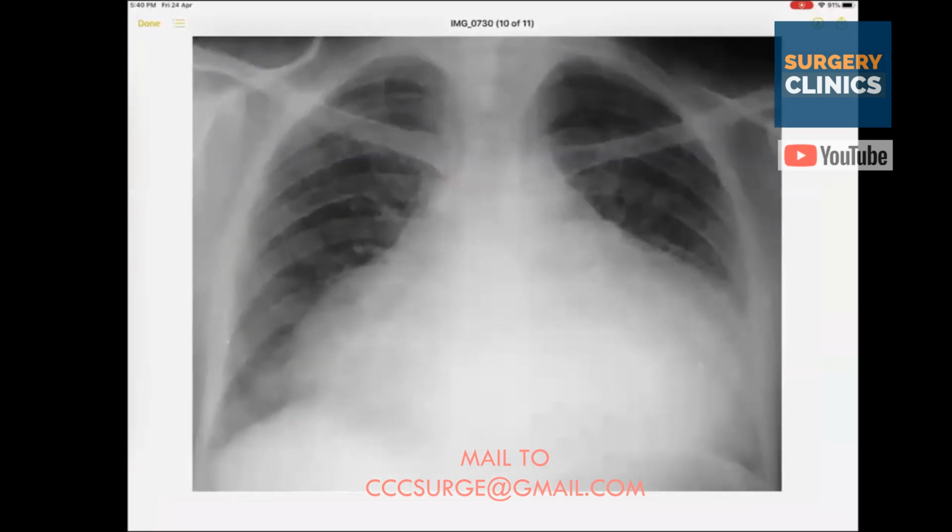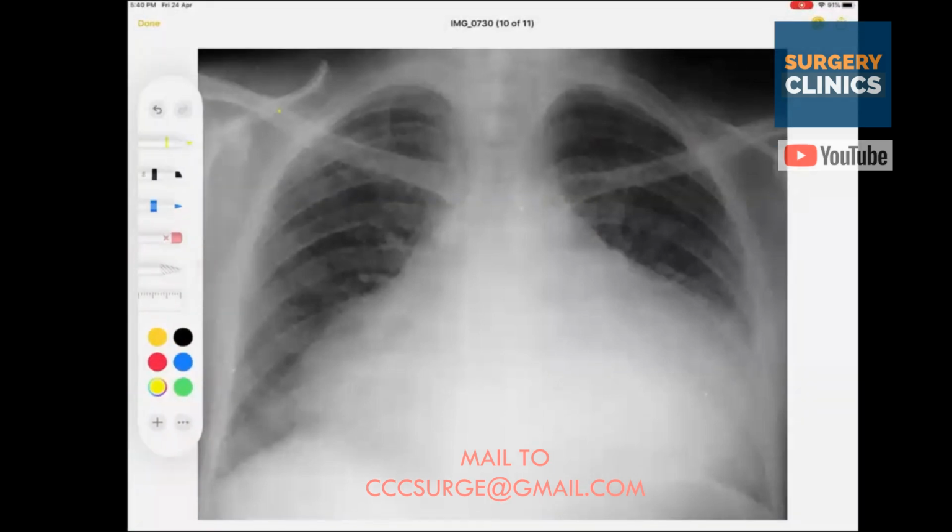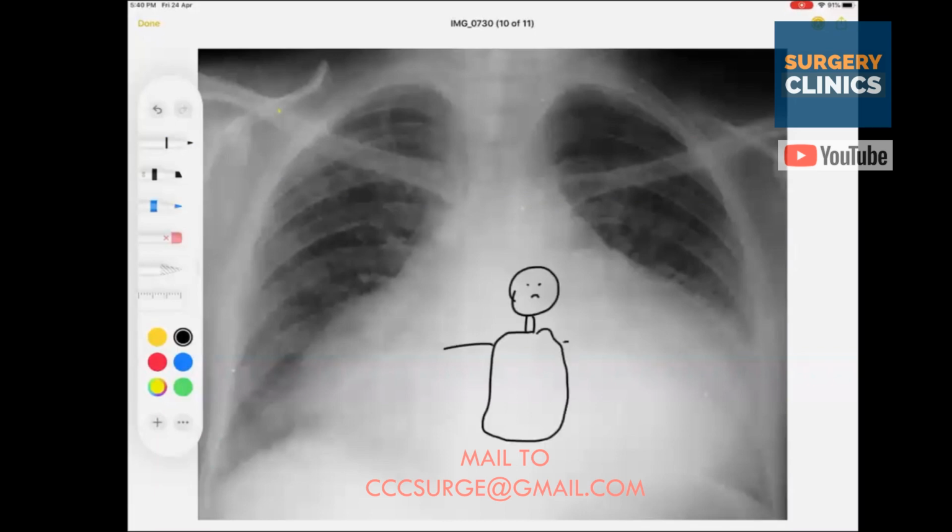Now, tell me, guys, this patient sustained a blunt trauma to his chest. So he was in a kickboxing tournament, and what happened was that this man got really hit in this part. So now, if this is the nipple line, this is the umbilicus, this chap got a big kick in this area. You say, wow, man, bad area to get a kick. And after he had a kick, he fell down and had a very severe chest pain, hypotension.